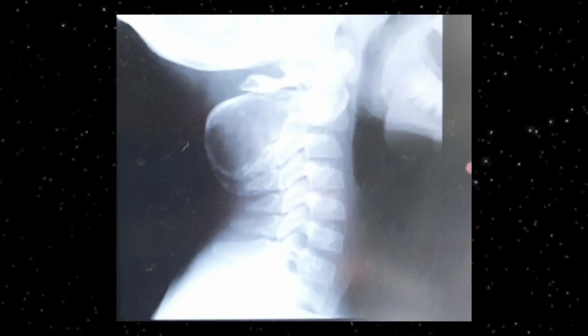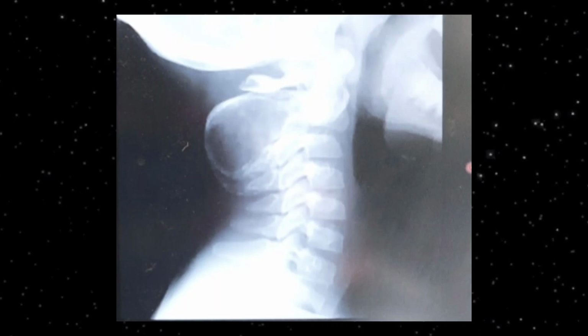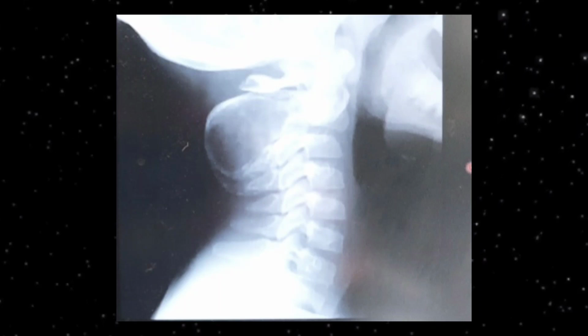This is another example, involving the transverse processes of a cervical vertebra. It is causing ballooning and expansion of the transverse process. However, there is no cortical breach and no fracture seen on these images. Centrally, a mineralized matrix can be seen. This is the characteristic of osteoblastoma, and as I said, usually it involves the pedicles and the transverse processes, and mainly the cervical and lumbothoracic vertebrae.